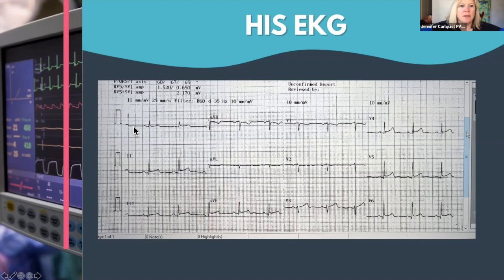We're going to do the thing we always do. Let me get a good color for us. And we basically go along and we see if there's any ST elevation, right? And there is. Yeah, there is ST elevation. And so the big question is, is it anywhere else, right?